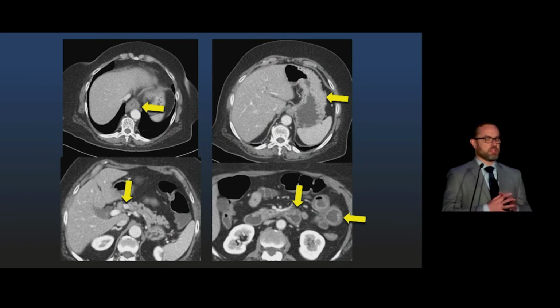Contrast that last patient with this one. This patient also has epigastric pain. They have gastroesophageal reflux. We can see some nice thickening and targetoid appearance of the distal esophagus. The gastric folds look thickened. And notice that there is some ulceration within the distal duodenum and some wall thickening and possible ulceration in the proximal jejunum. This is not a typical distribution for peptic ulcer disease. This is very distal duodenal and jejunal ulceration with the ancillary findings of gastritis and esophagitis.